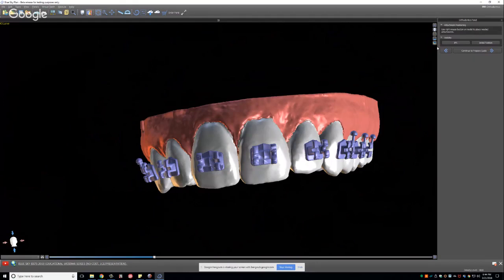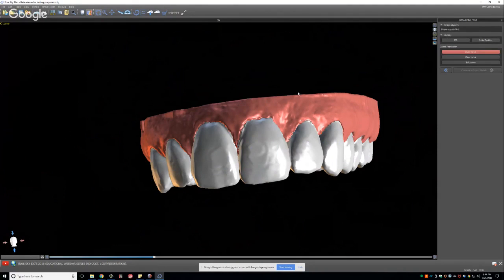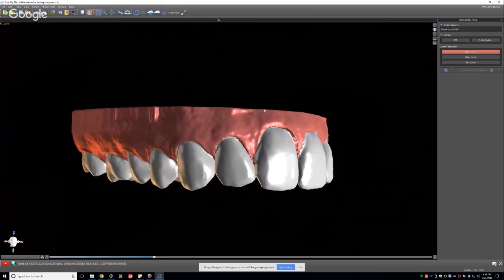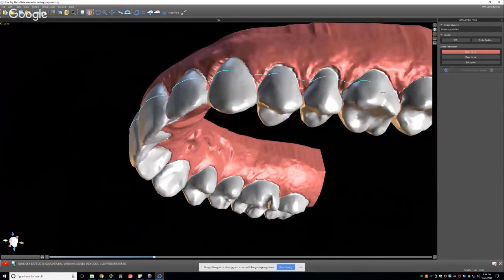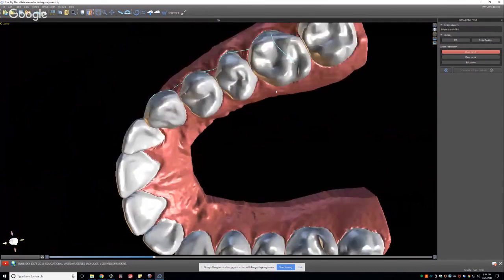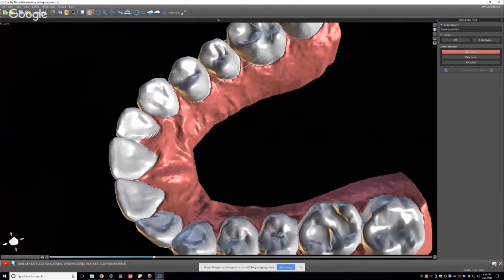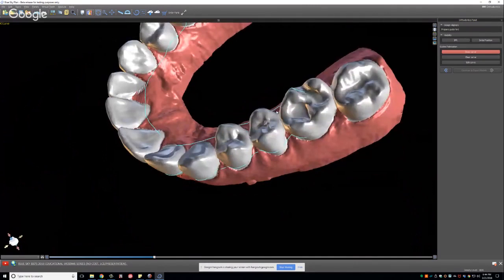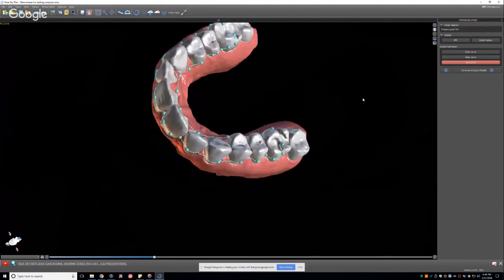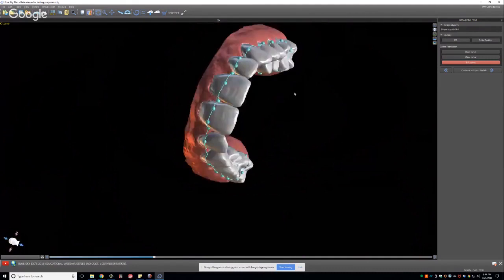Now, I'm going to warn you, right now the step is going to ask to create the tray on every single model. That's a known glitch that will be fixed very soon, but I just want to give you that heads up. That's a time where you walk away. To draw this line, I'm pressing and holding the shift button. This is the same as drawing a surgical guideline for those that are familiar. Click edit curve. You can change it if you want. Looks pretty good to me.